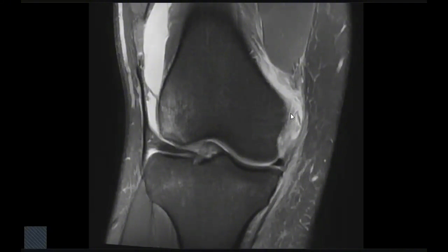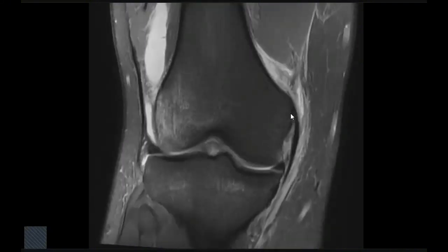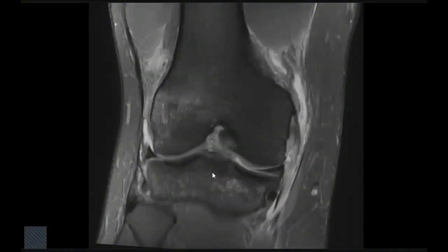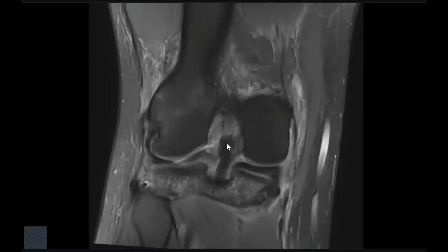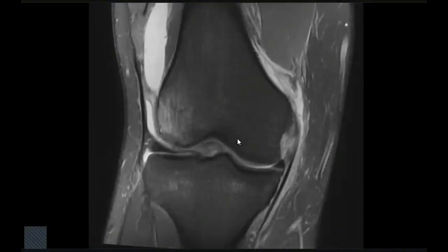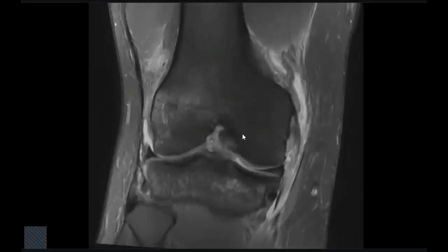First thing I can see is a contusion within the lateral femoral condyle, and I can see an abnormal signal within the intercondylar fossa of the femur, which I will assess later in the sagittal cuts.